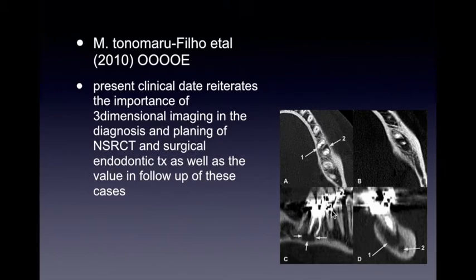In this particular case, the only thing that warranted CBCT imaging is that the patient appears to have symptomatic findings even after a rather good root canal.